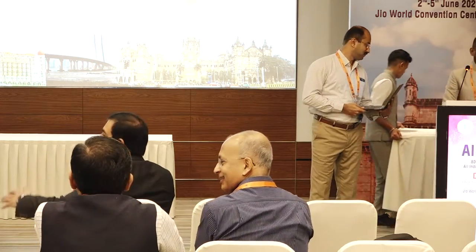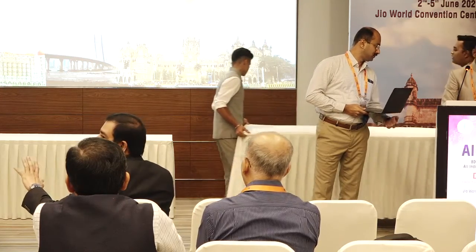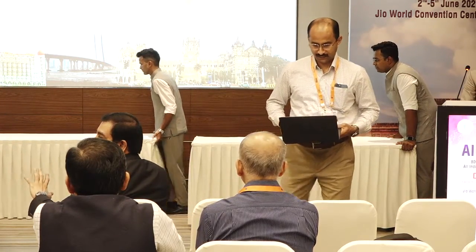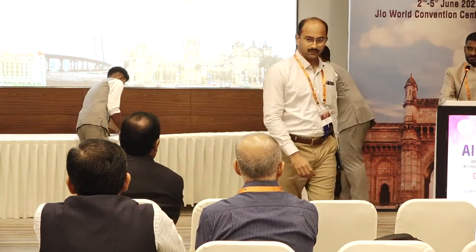Yeah, the systematic approach, don't jump in. Like, jumping into a grayscale is the last thing which you do. Similarly, that's what you have to see. You have to go through a systematic approach.